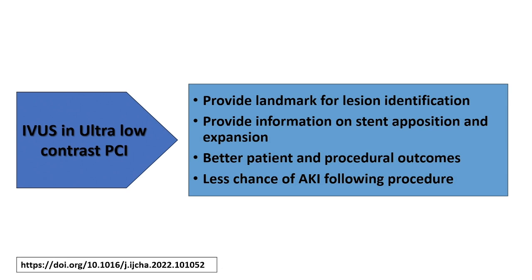IVUS in ultra low contrast PCI provides landmarks for lesion identification and information on stent apposition and expansion, giving better patient and procedural outcomes, with the least chance of AKI following the procedure.